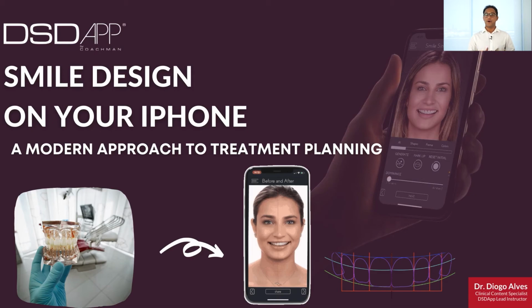Today, I want to show you how you can become a digital smile designer using the DSDApp. Today's topic is very interesting: smile design on your iPhone, a modern approach to treatment planning.